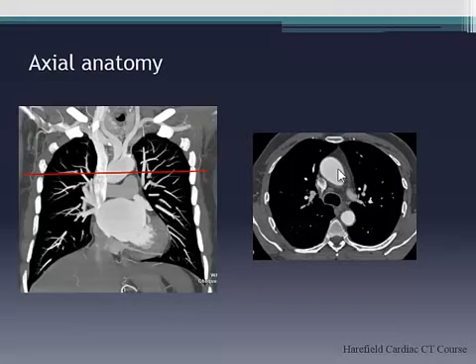So that forms the ascending aorta. Then if you look at the surgical definition, the arch is defined as from the brachiocephalic to the ductus arteriosum. So it's often beyond the left subclavian, but most people would take the arch as going from the beginning of the arch vessels to the end of the arch vessels, and obviously all the rest is descending. So that's useful when you're talking about dissections. You've got to be familiar with the anatomy because obviously type A management is totally different from type B.